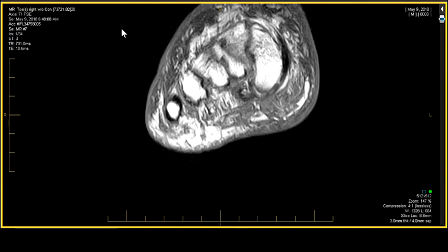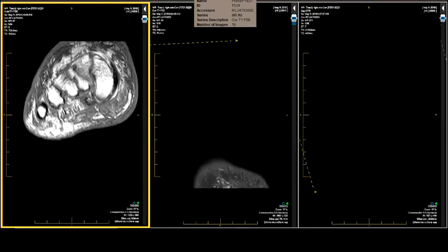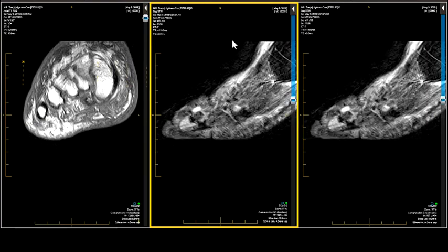10 weeks of ulceration in the first toe in an 80-year-old that keeps getting deeper and deeper. He's got neuropathy, and type 2 diabetes mellitus. Now, if you're sadistic or you have no environmental conscience, you can do an indium 111 study. Or if you trained as a nuclear medicine doctor and you don't do radiology, you might do a gallium study. And it would come out like this.